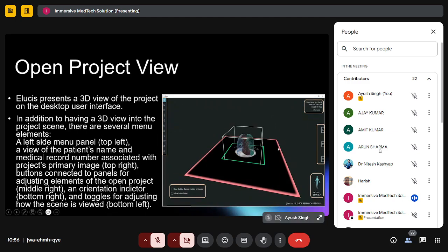One more added advantage that we get is the recording section. So even if we need to create screenshots for any part, we can directly click over here in our controller itself and carry out the screenshot generation. Apart from that, if we need to do the recording of the whole section, that too can be done in a very efficient way. We can record the whole sessions. We can also have our input as a voice. So even if we need to insert a voice memo, that can also be done, and we carry out the segmentation of the same.